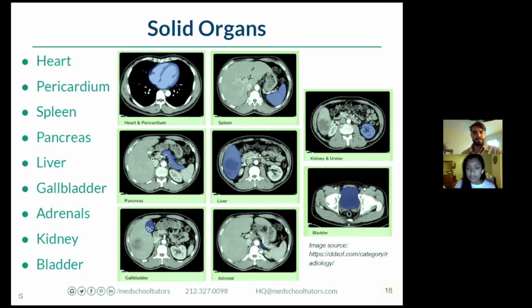Then here, this is actually the adrenal, but ignore it. Again, not a radiologist, don't worry about it. And then the kidneys right here, right? You see these bilateral kidneys. And then the bladder much lower down in the pelvis with all of the urine collected inside of it. So those are the major things that they'll test you on in the abdomen.